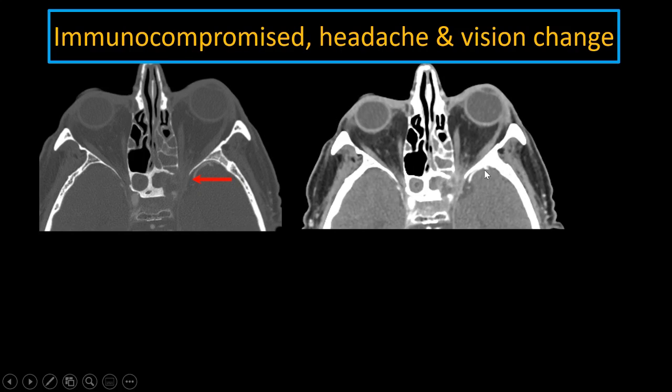On the soft tissue windows, we can see there's infiltration of the left orbital apex and abnormal soft tissue in the superior orbital fissure. Note also that the ipsilateral cavernous left ICA is markedly small in caliber compared to the normal right side, indicating an aggressive process.